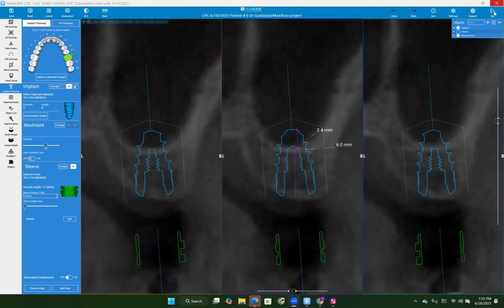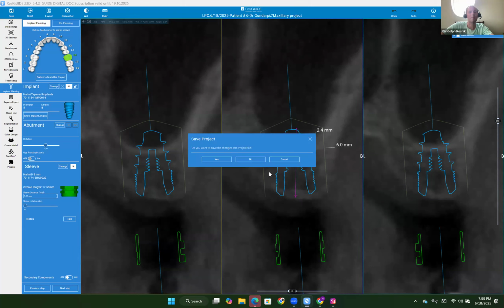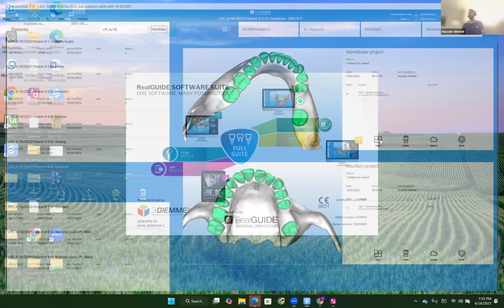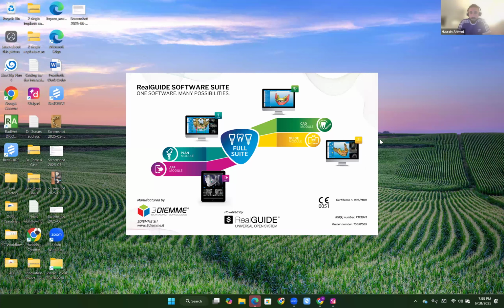Perfect. Thanks, Doc. Okay, now let's go to the bottom right here. Right away, sir. So at the bottom, Dr. Isaac, we've got a single implant at the site of number 30, sir. And I'm loading the treatment plan right now for us. Yes, he's going to the bottom now for that one. So it was for tooth number 30.